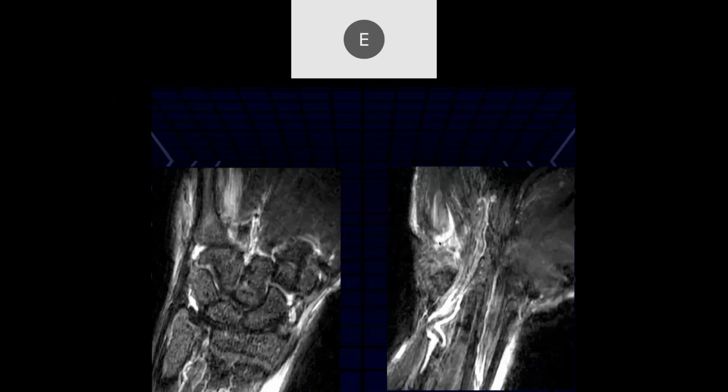Okay, Tayson. All right. So I do see this, what I think is maybe a lax tendon. Are you talking about this thing? Yeah. Okay. Yeah, this is a vessel. The veins often can be very serpiginous if you catch them this right.